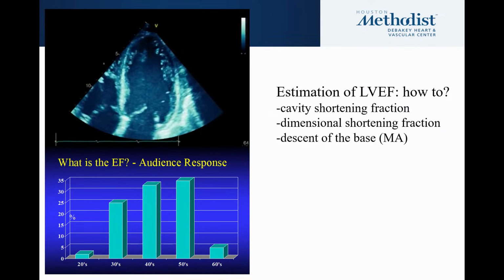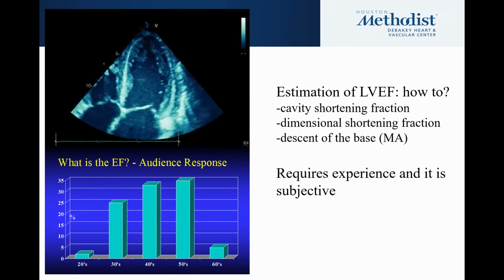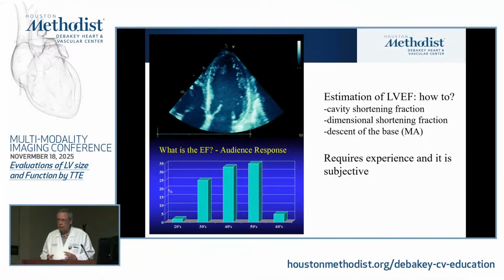However, you get somebody like this, nice quality image. Is that an EF of 60 or better? Is that a mid 50? Is that kind of a low 50s? Could that even be a little bit of high 40s? Those are the gray areas in estimation of EF.